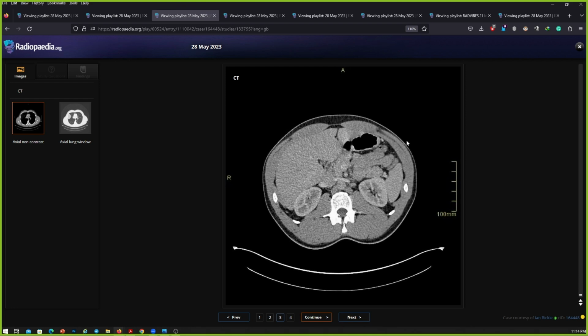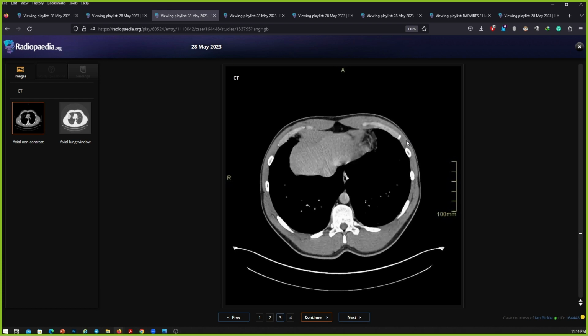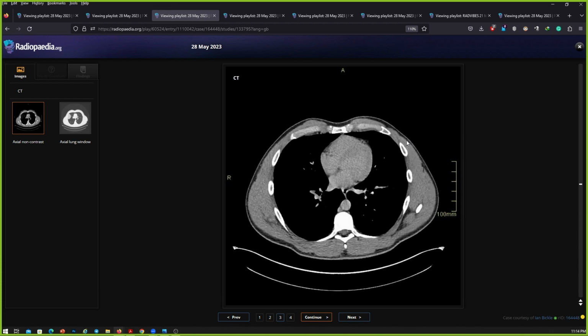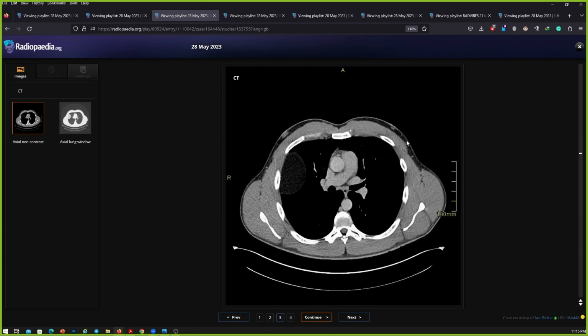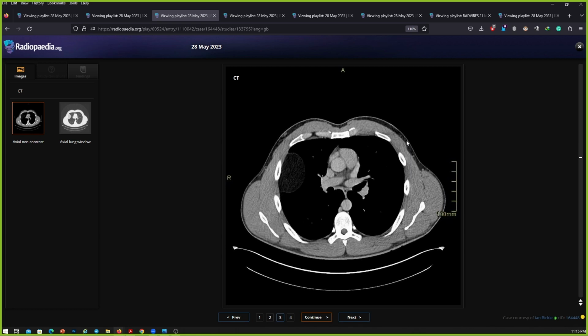All right, so this is a case of a pleural lipoma without any underlying rib or any other abnormality. If the patient is asymptomatic, then this would not be treated aggressively, and routine follow-up is enough. If there is any sudden increase in size or if the patient has sudden onset of pain in this lesion, then only the management of the patient will be considered. Is this a benign lesion or an aggressive lesion? This is a benign lesion.